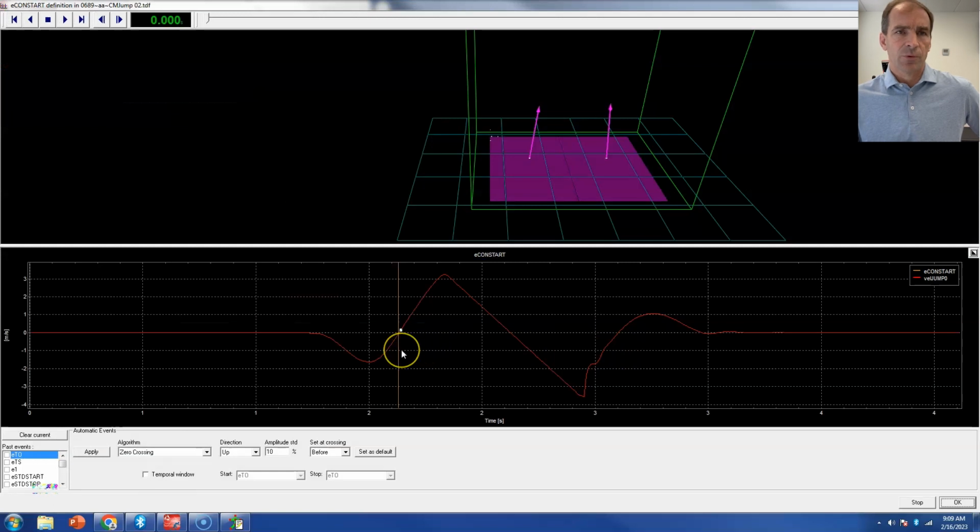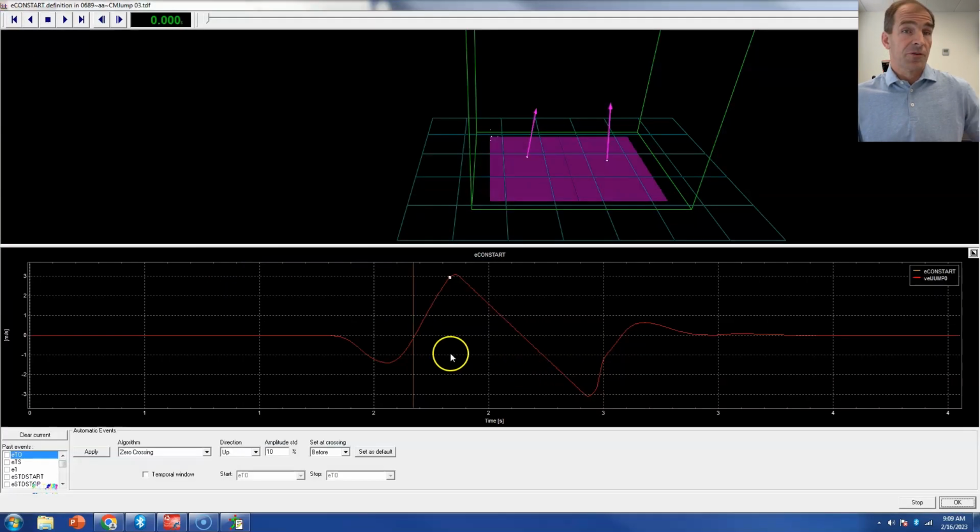The second one's good, yeah, very good with that. We'll hit okay. Our third one is good as well. Now, I will tell you occasionally when I'm doing analysis of these, if I'm going to see an error, oftentimes this orange line will get moved up towards the beginning of the change in acceleration and velocity, so you're going to need to move that. But this is really the location you want to have this marker in. So again, I'm okay with this.